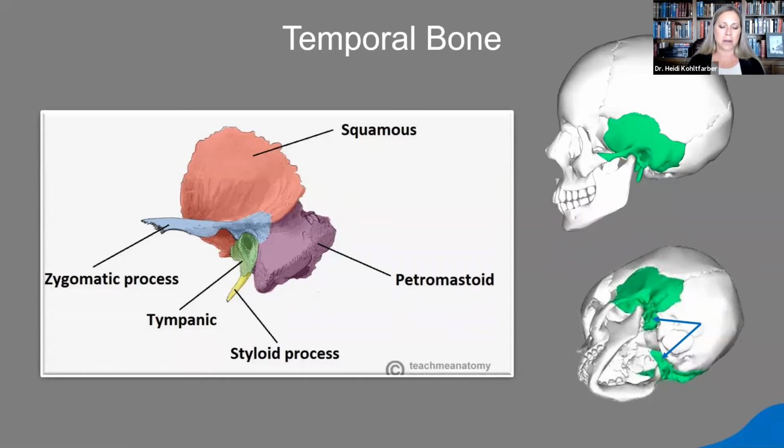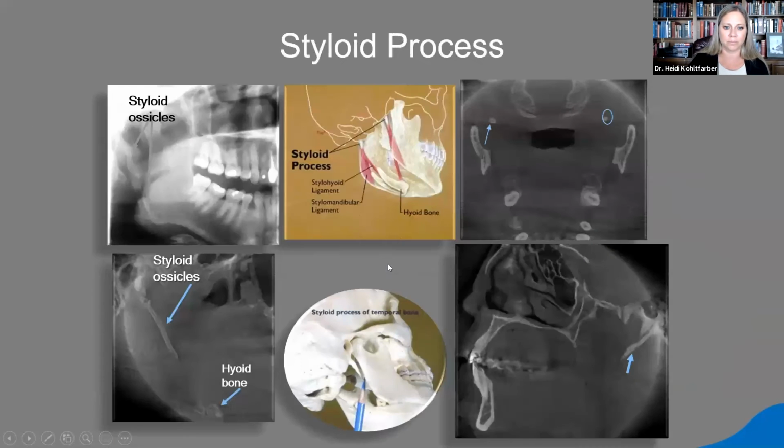And our mastoid air cells follow that same rule in that they typically are not symmetrical. Now, we can see pneumatization of our mastoid air cells anywhere throughout the temporal bone. It's not uncommon to see them within the zygomatic process as well. So again, they can pneumatize anywhere throughout that temporal bone.